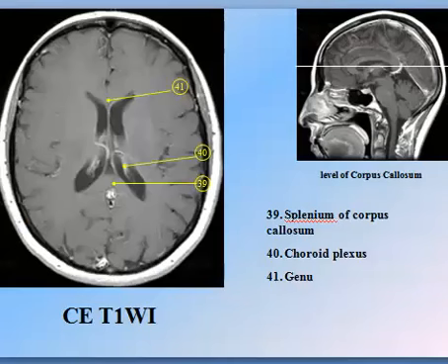Now collectively again, two internal cerebral veins lying in the most upper part of the cistern for the vein of Galen, or the large superior cerebellar cistern, and then we have the choroids, we have the genu of the corpus callosum, we have the splenium of the corpus callosum.